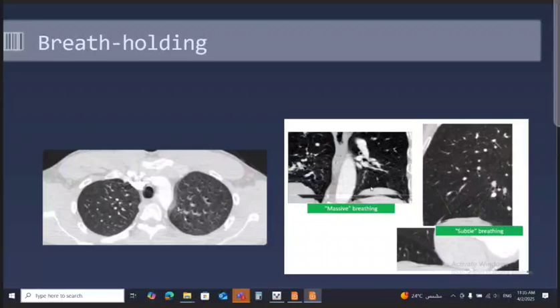The respiratory motions can be appreciated also in the coronal plane when looking at the diaphragm, imaged twice like this. This means massive respiratory motion during scanning.